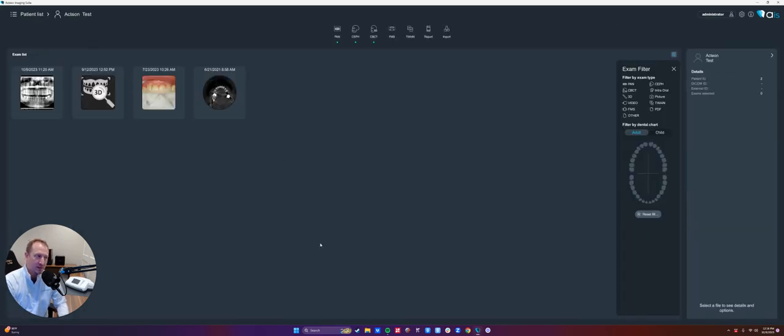And here we'll see this is the patient's chart, if you will, our imaging chart. I have a couple things that I've pre-imported for us here. We have some 2D images. They can either be x-rays, like in this case, a panoramic image. We even have some clinical photos. If you wanted to import and therefore store your patient's imaging in a HIPAA compliant manner, we can simply go up to the top bar here, import file, and find the file that you're looking for.